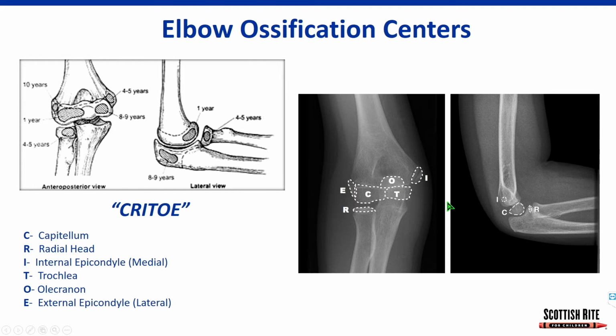That happens, like I said, quite often with these ossification centers. There's such a variance of not only what this may look like by chronological age, but all these kids, every 7-year-old doesn't develop at the same rate. And every time you have one of these x-rays, there may be a degree of variability in there.